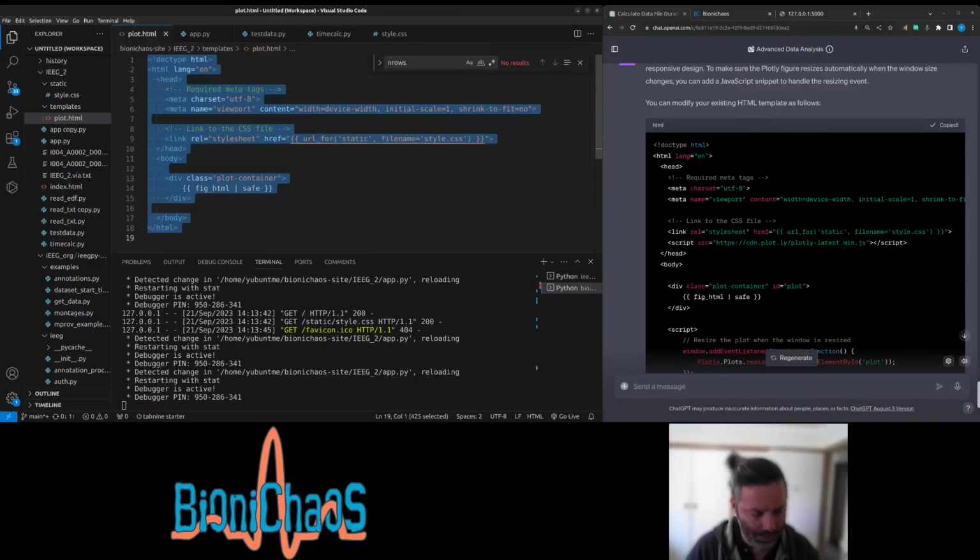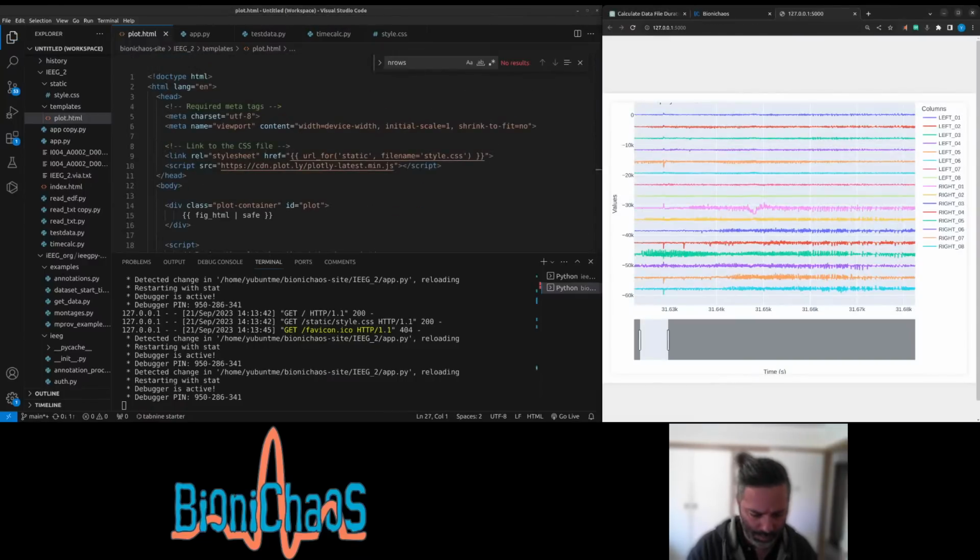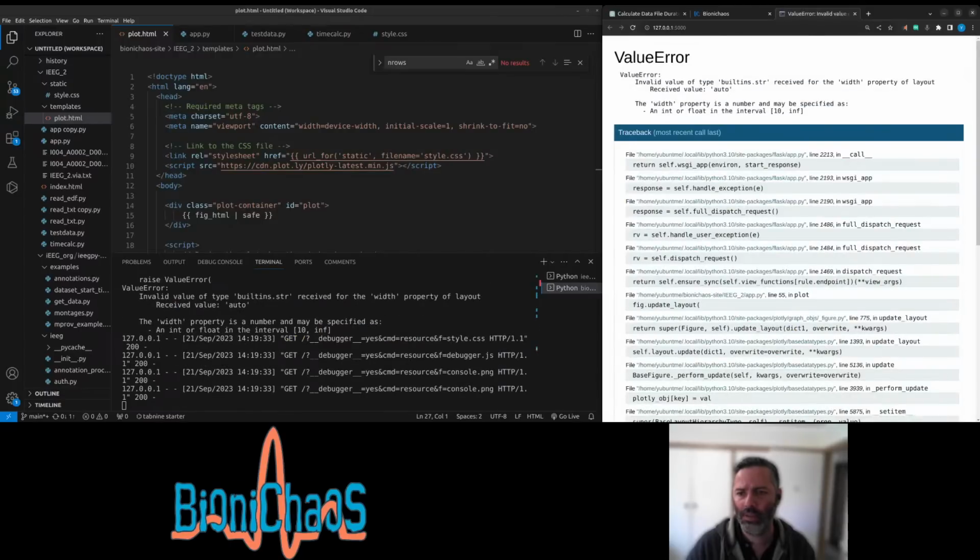I'll give it a go. Because the scaling is pretty bad as it is. Right.